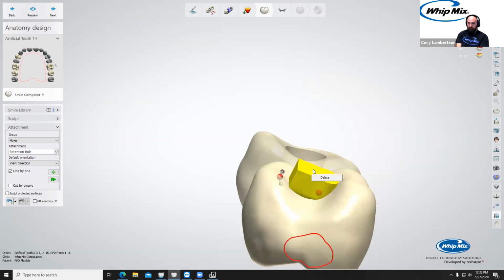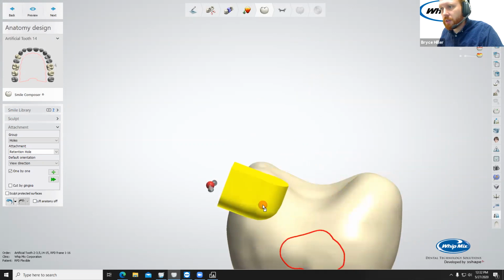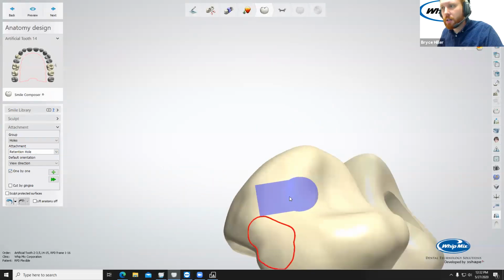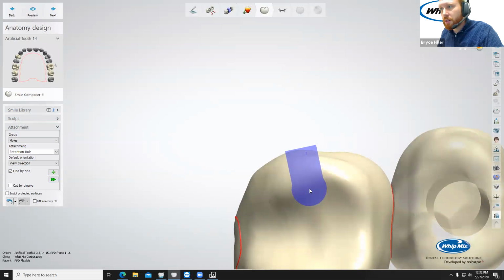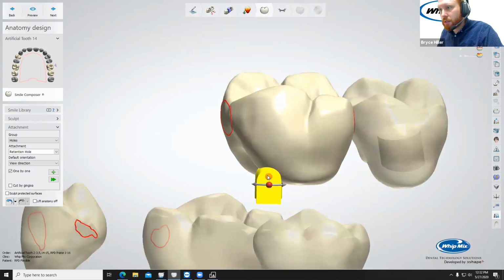And then I'd move it out to that lingual surface and almost create like a... The only problem is that they don't give you a lot of manipulation controls over this one, which is kind of annoying. Yeah, it's kind of weird. Let's try adding it again. Now I've never actually used one of these before. Let's do it there. Let's see what that does, just for kicks and giggles. Ah, yeah, it won't let you make it any deeper.